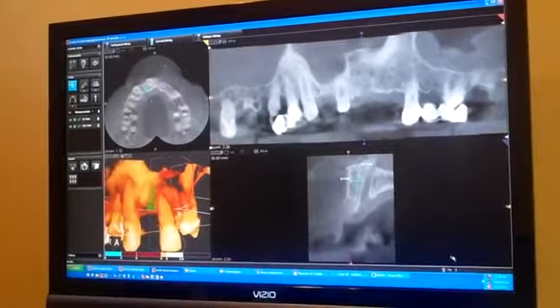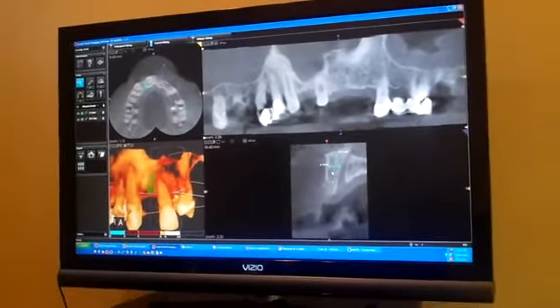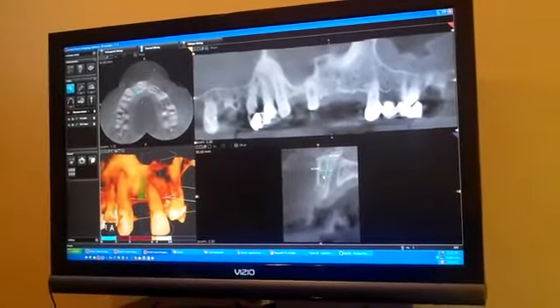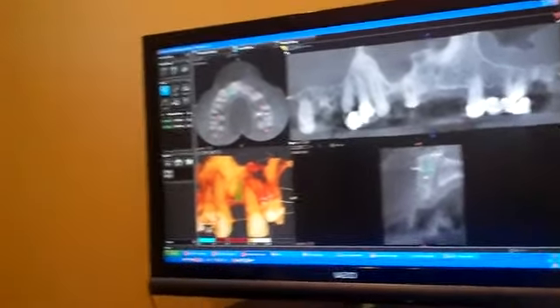It also gives us what's called Hounsfield units down in this corner. So if I put my cursor on an area of bone, that's about 300 Hounsfield. So it's not really the strongest and densest of bone, and so you have to think about that and what kind of technique you would use to condense that bone to get a stronger stability for the implant. So it is very critical, important information when you start looking at implant diagnostics. It can be also used for TMJ diagnostics to verify what's happening within the joint with three-dimensional imaging.